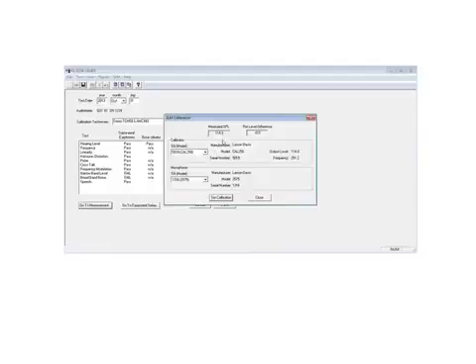Ideal would be 114.0. If you get it to 114.0, we can probably continue. We don't need to make any changes. If for some reason it's off by a little bit, then you can go ahead and do a set calibration. Typically, this equipment is very close, within a few tenths of a dB, day to day, day after day. It's very impressive that it can hold those kinds of stability with the acoustics.